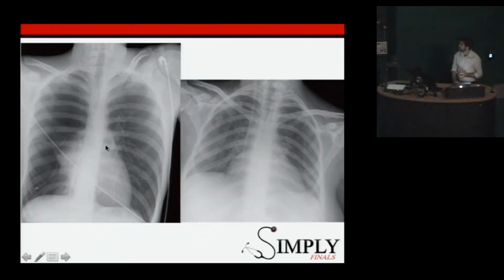More lines. What are the lines on this one? So ECG, yeah, and a chest drain, yeah? So you can see the pneumothorax on this side. Lung fields here. No lung markings here, sorry. And the chest drain here. And that's an ECG lead. And then this one here. No, central line, yeah.